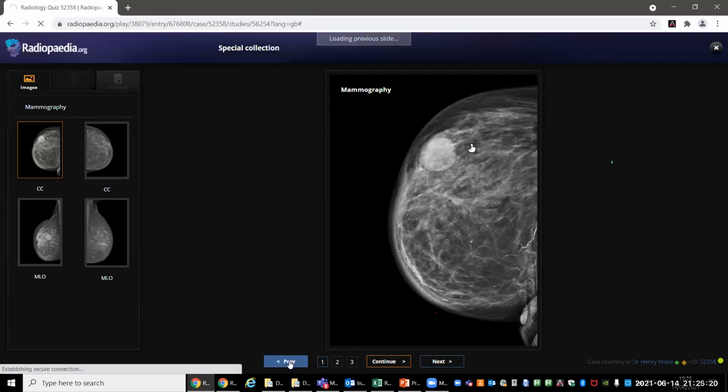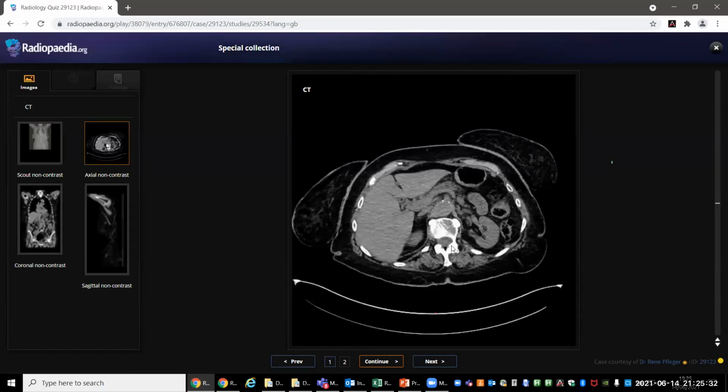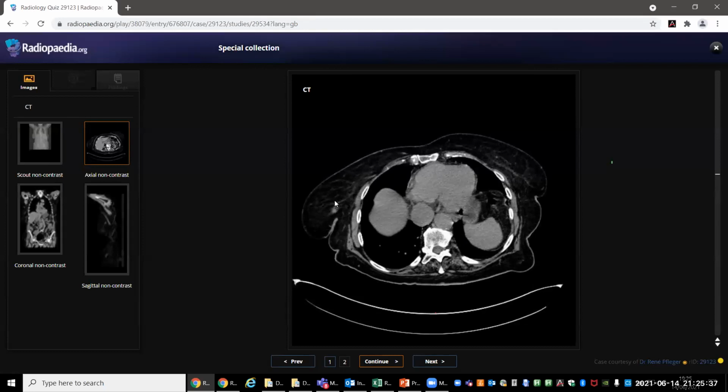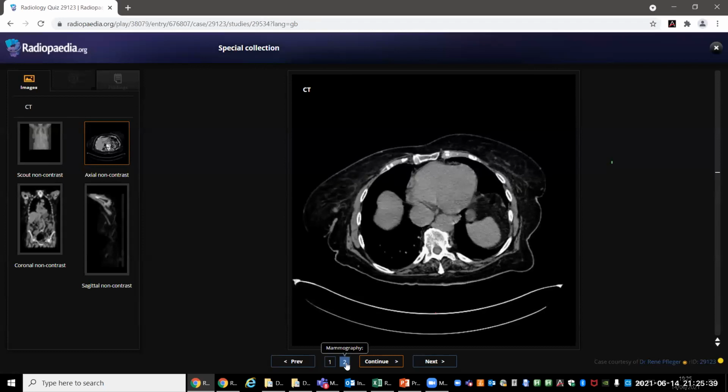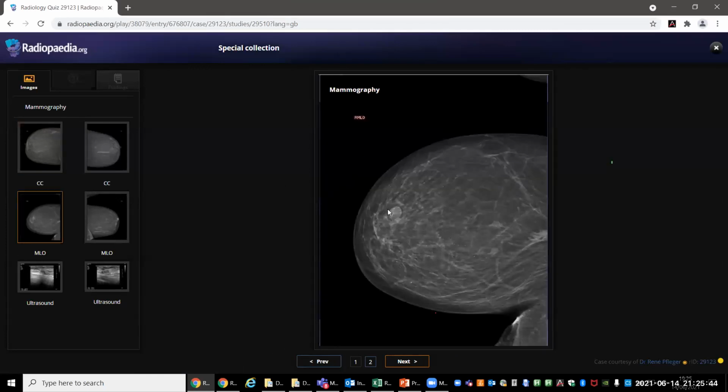Okay, ma'am. The previous one, the dermoid, was a distraction. The main thing about this was that breast lesion, and you described it as spiculated. It's not spiculated, really. It's quite round, not very well-defined margins though, but on mammogram it's not spiculated, especially on the MLO. It's quite round. Okay. Quite round, but if the halo around it is not complete, this still makes it suspicious.